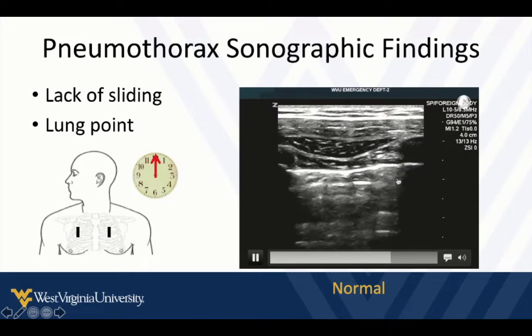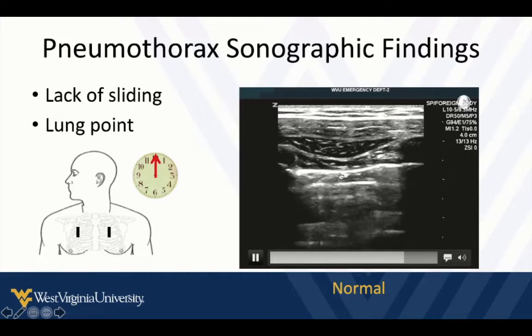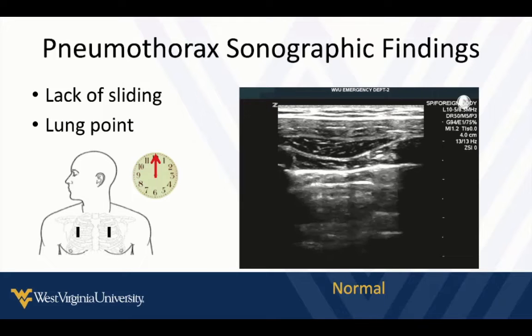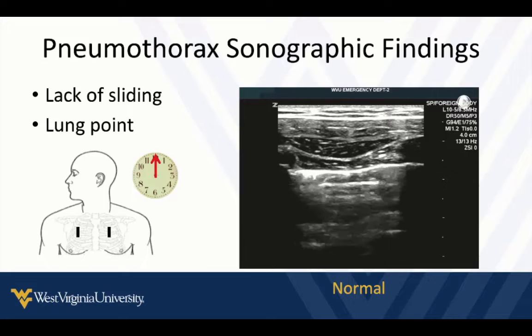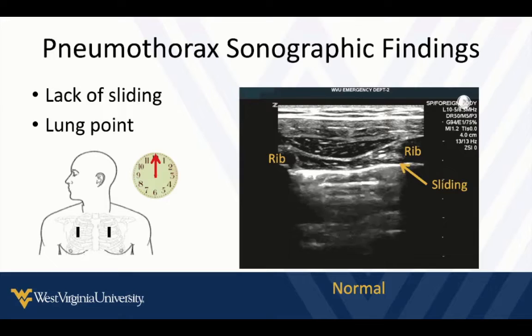Sometimes in normal lung, you'll see these little artifacts. Some people call them comet tail, bright white artifact. They just sit right about the pleural line. They don't really dive down into the lung area themselves. Indicators towards the head, and often the best place to look for pneumothorax is the most anti-dependent area, or the place closest to the ceiling, because air likes to rise, correct? So they're just pointing out the findings. Make sure you kind of get this pattern locked into your brain.